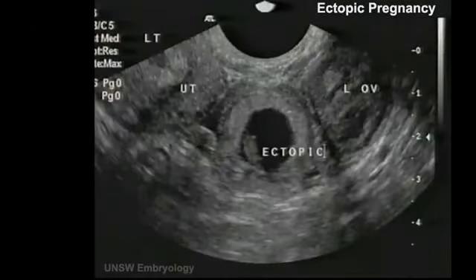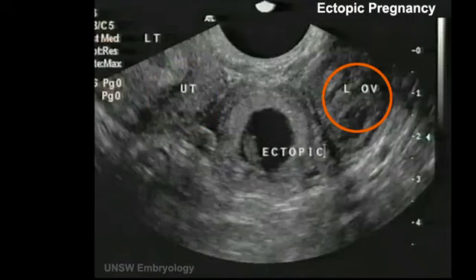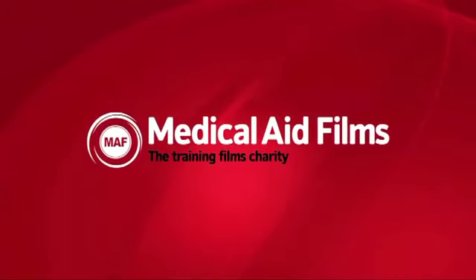So where the ectopic pregnancy can be clearly seen in the fallopian tube, we can see on this slide nicely demonstrated an image of a gestation sac and an embryo lying between the uterine cavity and the left ovary. It's quite difficult to visualize an ectopic pregnancy like this, and frequently ectopic pregnancies are actually diagnosed by exclusion on finding an empty uterine sac at an advanced gestation, without having the actual positive finding of the ectopic pregnancy itself.